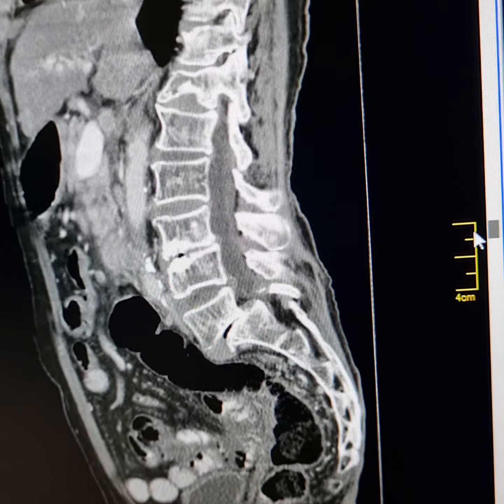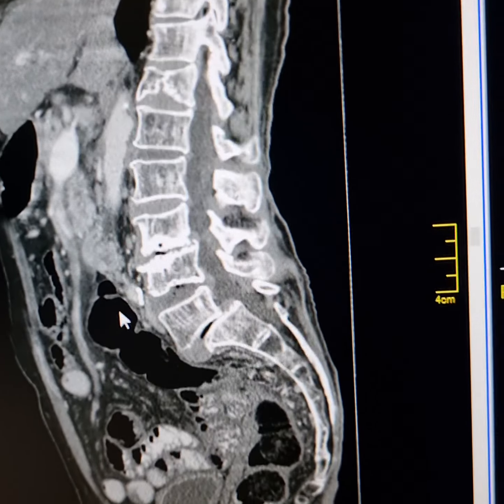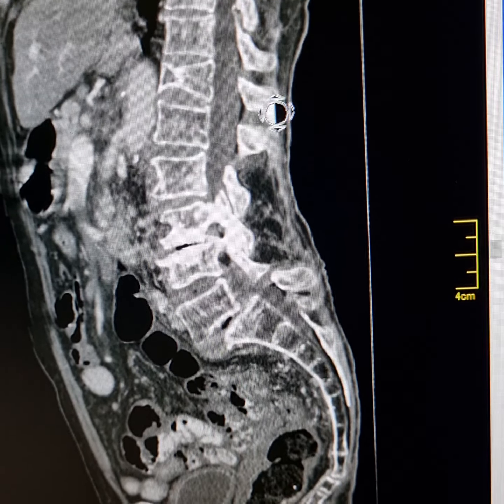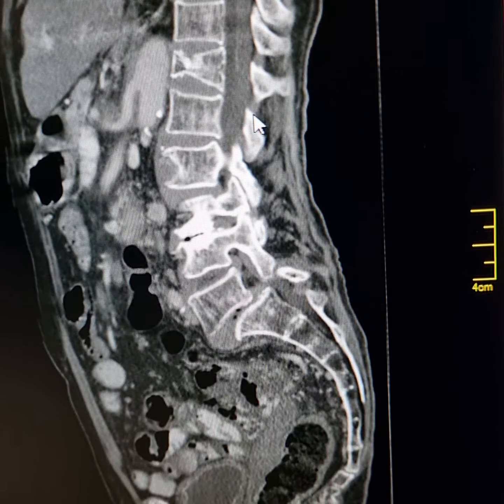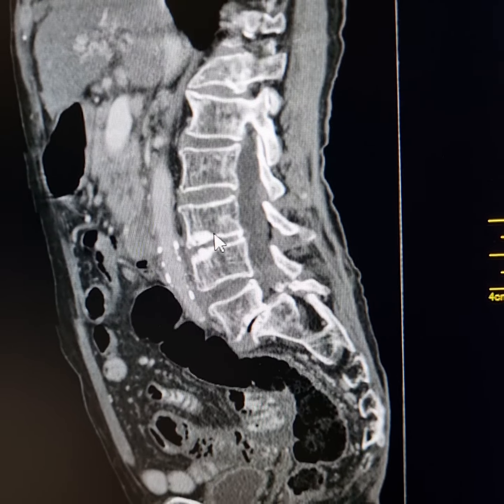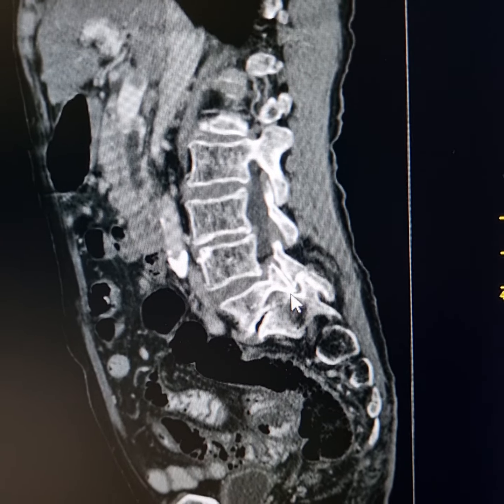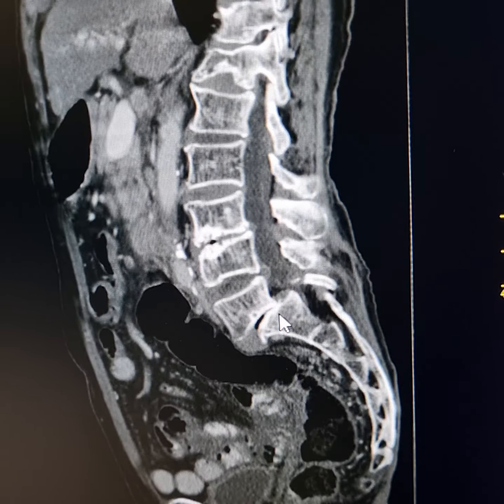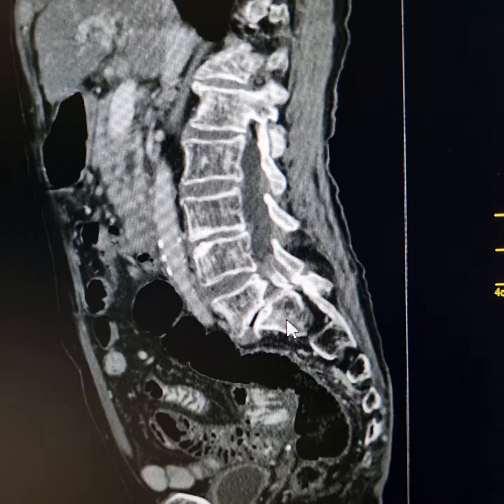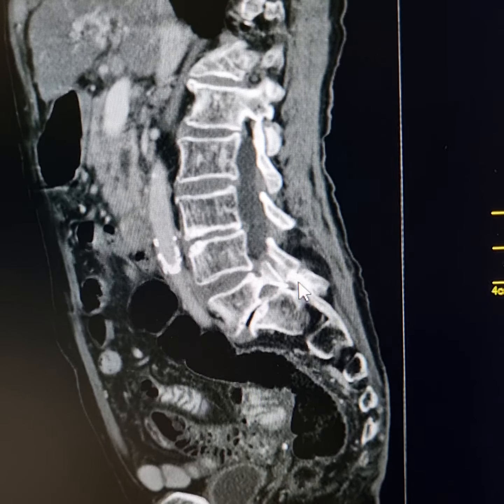Please observe the moderate osteoporosis and moderate degenerative spondylosis. DV12 is partially compressed, most probably because of the effects of trauma and the osteoporosis. Now please observe that there is spondylolysis at the level of LV5, this one here. There is grade 2 anterolisthesis of LV5 over SV1. This is the break in the pars interarticularis at this level.